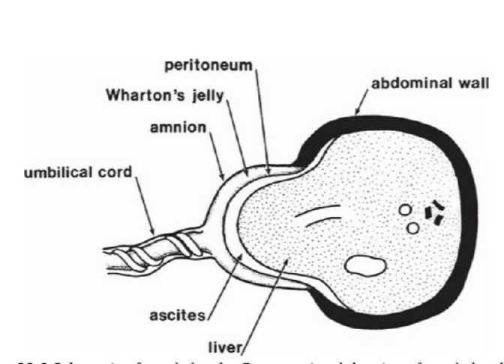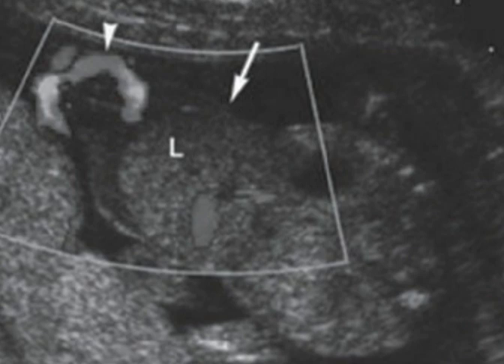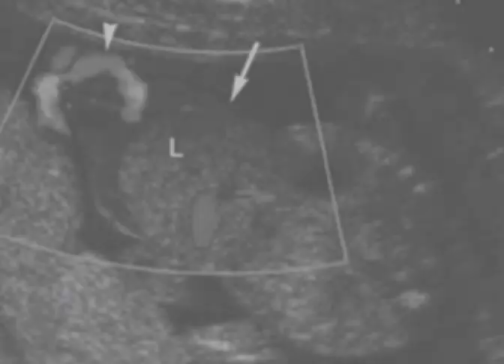Now let's learn how to identify an omphalocele. Omphalocele is a congenital midline abdominal wall defect where abdominal contents, usually bowel and sometimes liver, herniate into the base of the umbilical cord. The key feature, it is covered by a membrane. On ultrasound, look for a midline defect at the base of the umbilical cord with herniated contents enclosed in a thin echogenic membrane. If the liver is seen inside the sac, it strongly suggests omphalocele.